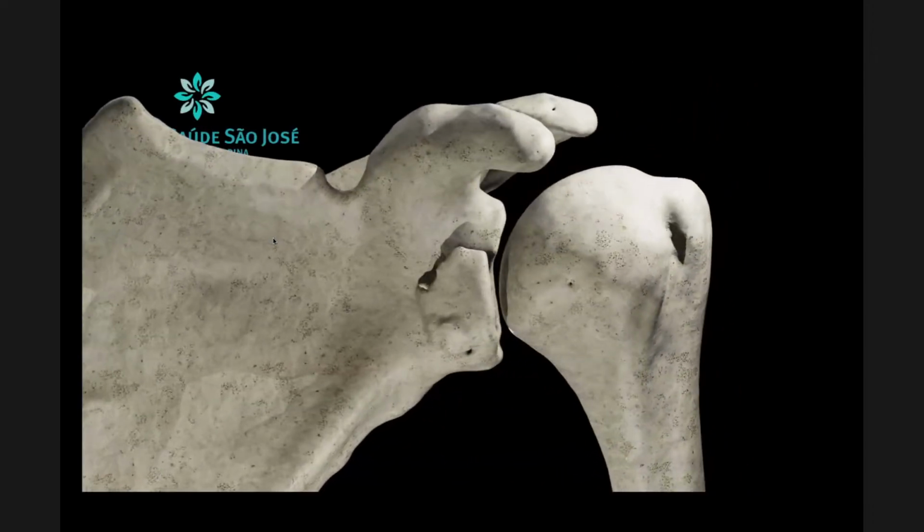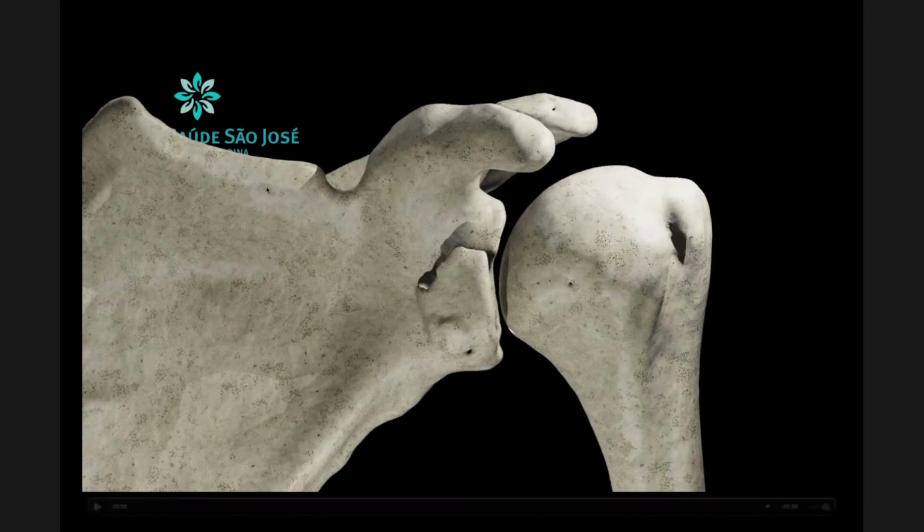I don't know if you are aware of this, but in radiology they also call it cinematic rendering. But cinematic rendering is a brand of a big vendor. They usually use this name to generalize this advanced 3D viewing. Okay.